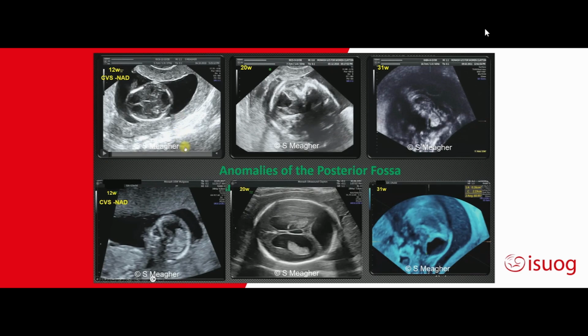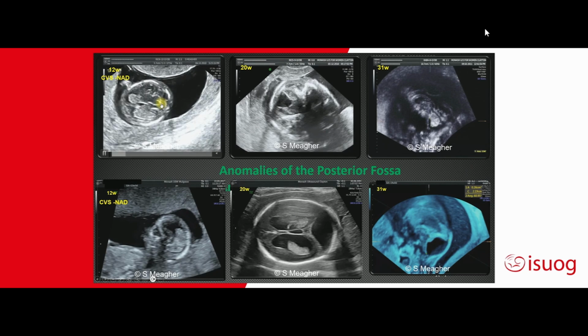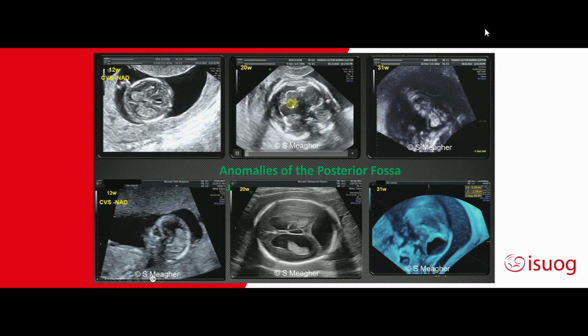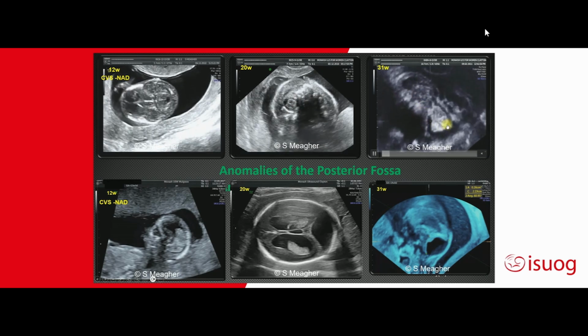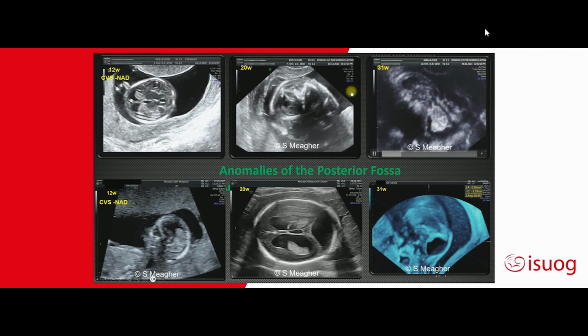So let's say the chromosomal microarray comes back normal. You have a fetus here with a dilated cerebral fourth ventricle and nothing else. What's going on? When you bring the patient back at 20 weeks of gestation, you see all the typical features of Blake's pouch, and fenestration occurs. You have a normal vermis at 31 weeks of gestation.